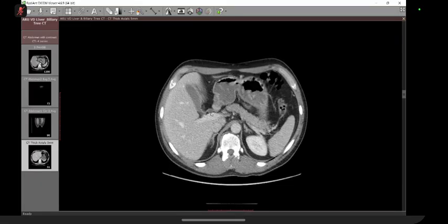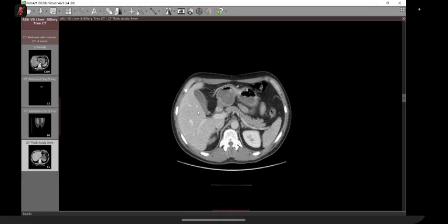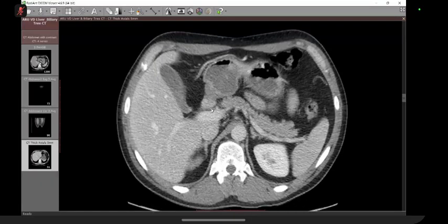Please remember your anatomy. There is a structure here, linear, which with a stretch of imagination you can see. What is this? Bile duct. And this is what we see on ultrasound. You just put a probe there, and this is a double barrel type of a thing. The inferior one is the portal vein, superior is the CBD. And this is what we do on ultrasound. And if it is dilated, we see it very well.